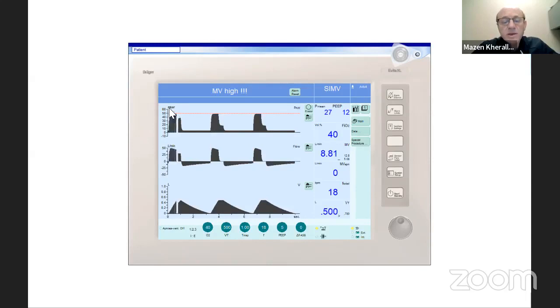Of course, that's going to be associated with an increase in the peak pressure because it's higher flow. Okay, but the plateau pressure is the same. It did not change. So all this is actually central to the airways. It's centered in the airways. It's probably not transmitted to the lungs much. All right, and now as a result of increased flow, you can see that we get the plateau back. So when we increase the flow, we did not gain anything towards the expiratory time.